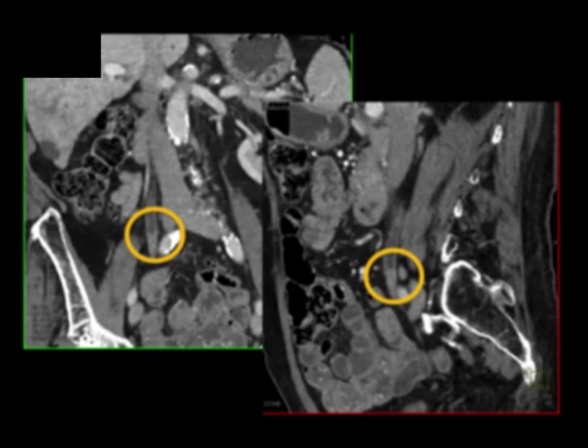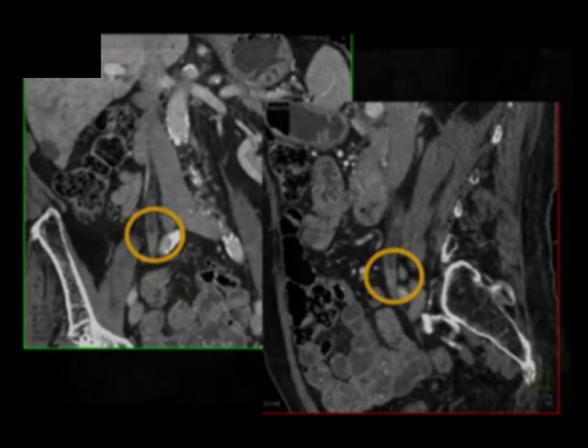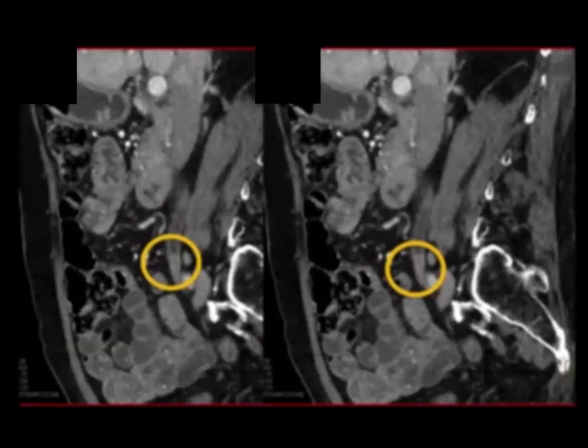This case also makes a very good point. People say, well, I got to wait longer, I got to get more delayed to get the contrast opacified. Well, you know, patients are obstructed. It takes forever to get contrast down the ureter. But you don't want to wait. You don't need to, and it doesn't help. The way I think of the ureter, if it's obstructed, if there's a tumor like this case, it's very much like looking at small bowel, where water is the best contrast agent. Here, water is an excellent contrast agent, and then you see the tumor standing out very nicely.